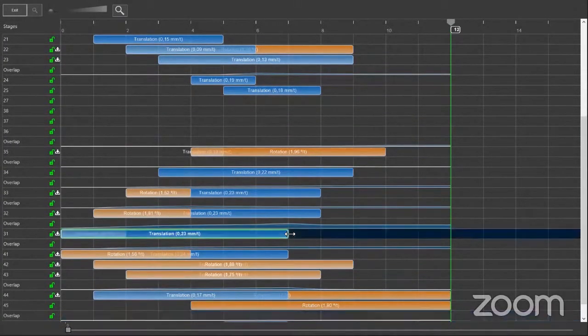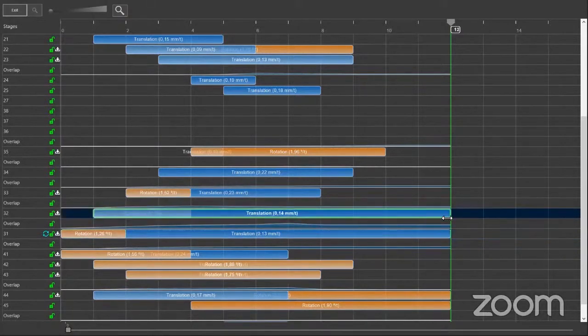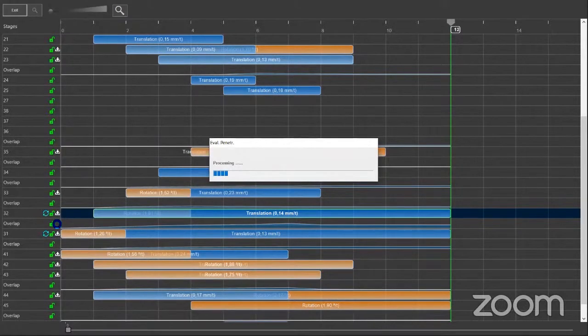Okay, so let's see what we can do. For one thing, I'm going to make the movement a lot slower, both of them. Actually, maybe we're going to rotate first, and then we're going to make the movements. And let's see if just by that we can reduce this interproximal reduction. So if we can minimize it, or if we can send a little bit to other teeth and not have all of it concentrated here.